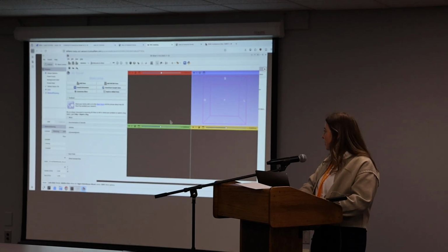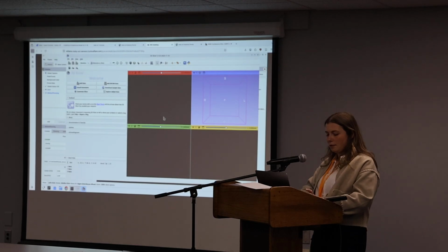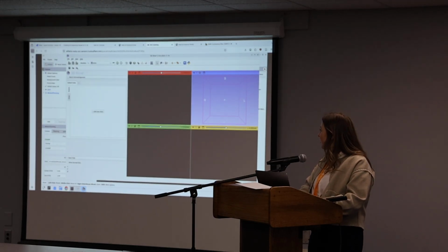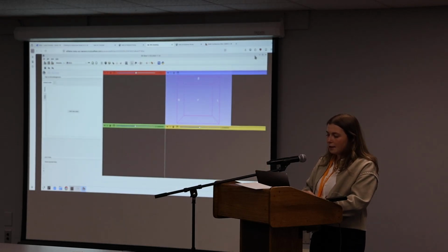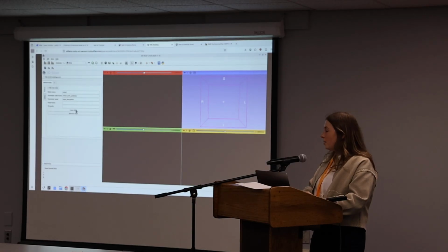Now we're going to switch to the ROS2 module. If you do Control F, you should be able to type ROS2 in, and that will switch you there automatically. Make this full screen, and we're going to do the same thing of adding in a new robot, and then just pressing load robot. And you should see a UR pop up. Is it working for people?